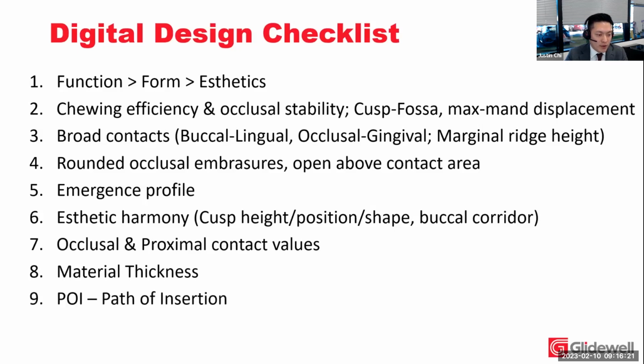And then from that point, another thing to consider is the path of insertion. Once you've established the design, these digital design softwares do have a function where you can visualize your design with the adjacent teeth and your preparation, visualizing undercuts and how those may impact the seating and fabrication. First of all, the manufacturing and milling of that restoration, and then also how it may seat and potentially have hangups as you're trying it in on the patient.